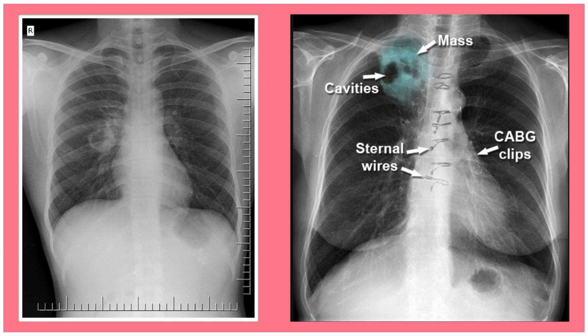And on the second picture, this patient had a previous history of coronary artery bypass graft surgery. As we note, the sternal wires and clips are there, and we see also well-defined cavitary lesions in the right upper lobe, and in such case it is lung cancer.